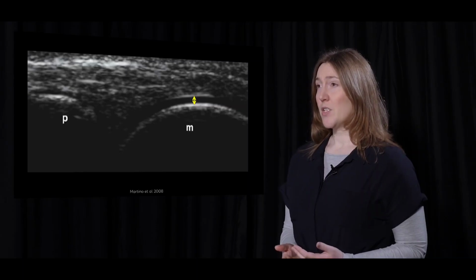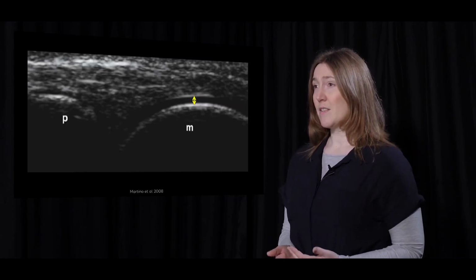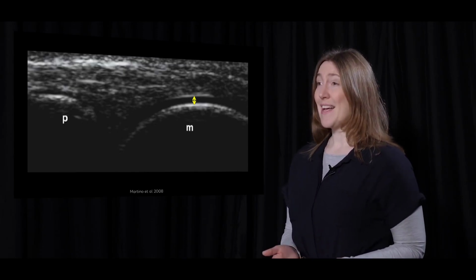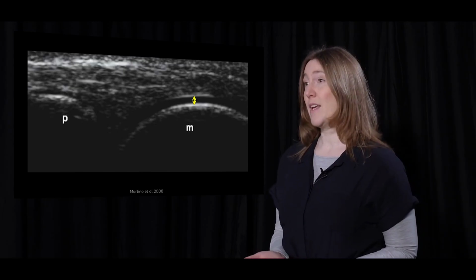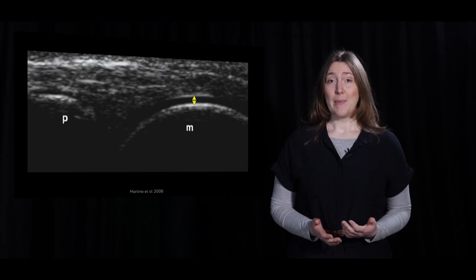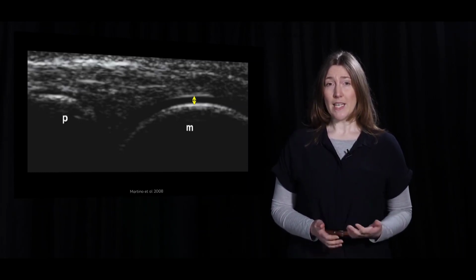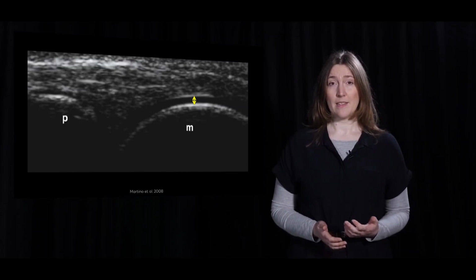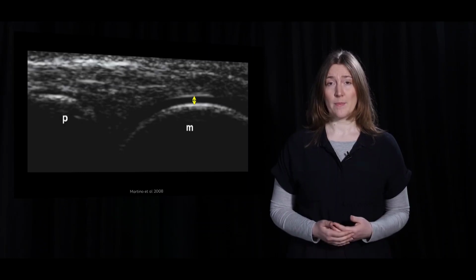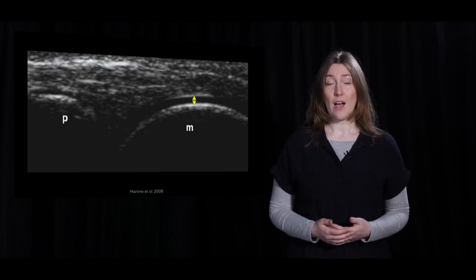Measuring hyaline cartilage could be useful to quantify the amount of hyaline cartilage present or to see if there are signs of osteoarthritis. Measuring hyaline cartilage thickness is fast, non-invasive and thus pain-free, and shows a very good reproducibility. In this image, the MCP joint of a healthy subject was scanned longitudinally. The articular cartilage of the metacarpal head appears as a homogeneous anechoic layer with clearly defined hyperechoic contours. These clearly defined contours offer good landmarks to measure the hyaline cartilage.